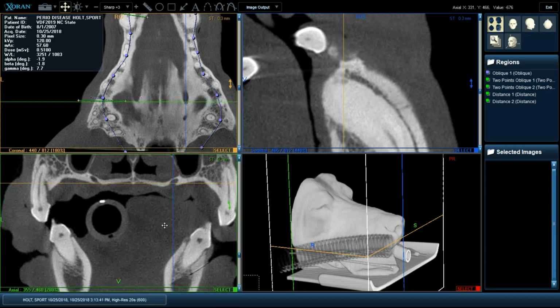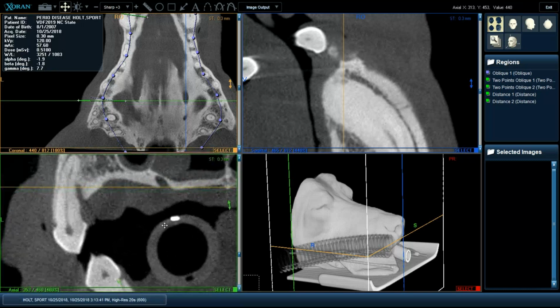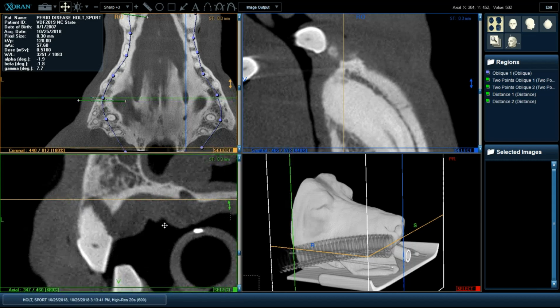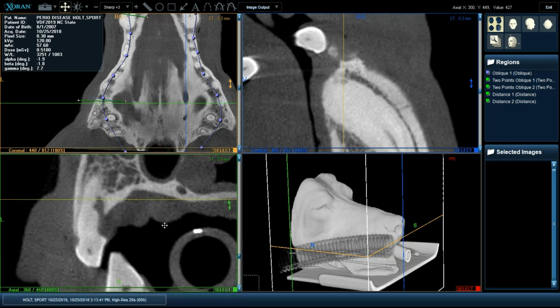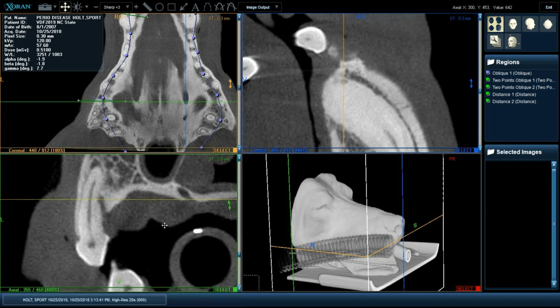There's a couple little details that we see now more easily on the cut as well. And here's just an example. In this case, we can appreciate an intra-bony defect palatal to a root, something that would be hiding from us if we were to look at a projection. Of course, this is a large lesion, so it's relatively obvious, but we'll see isolated lesions, sometimes associated with root resorption, like we see here, on the direct palatal of a root.